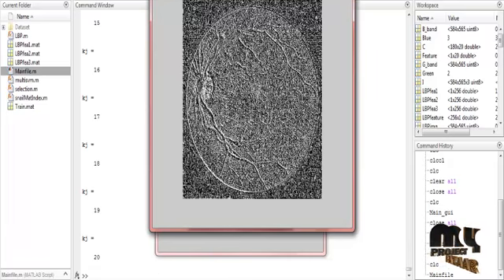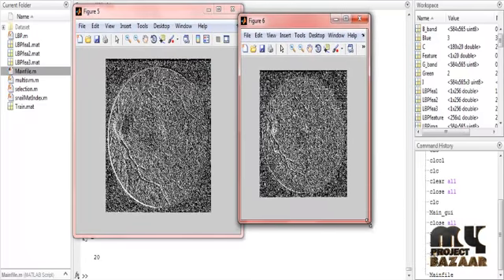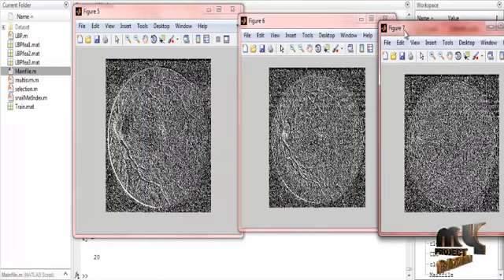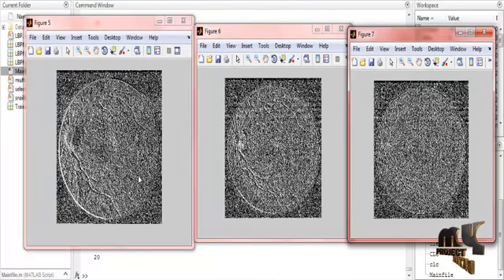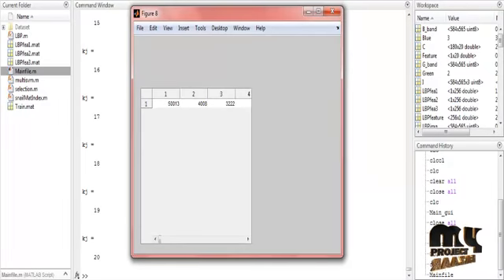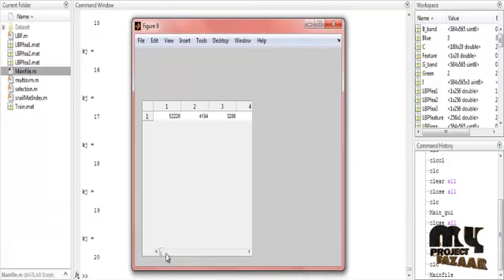In the next figure, because we separated the image into RGB, 3 types of processing are applied: R, G and then B. These are the 3 types of process in the LBP feature extraction, to extract features using the red channel, green channel and blue channel. All the channels are given to the feature extraction process. In the next figure, these are the values to extract the features. These are the values of the particular fundus image extracted using the local binary pattern. In the next figure, this is also feature selection.